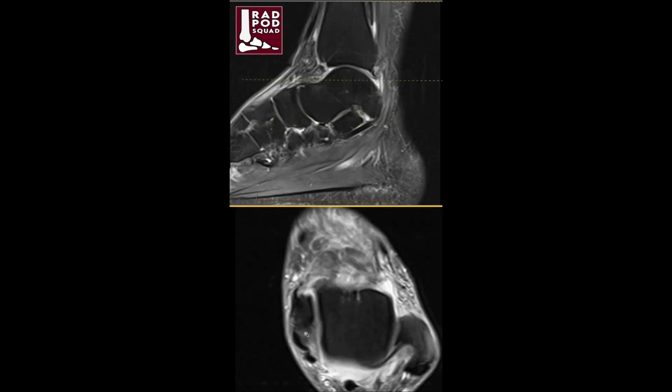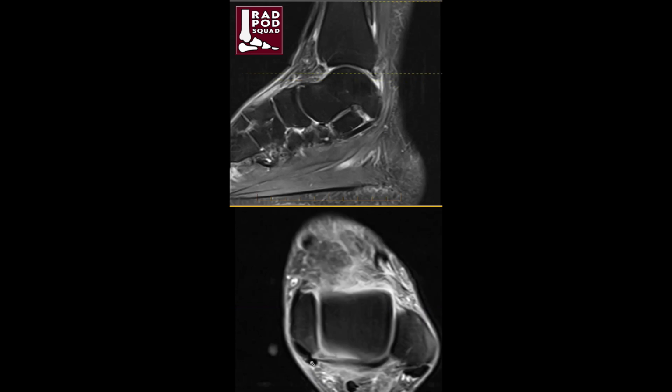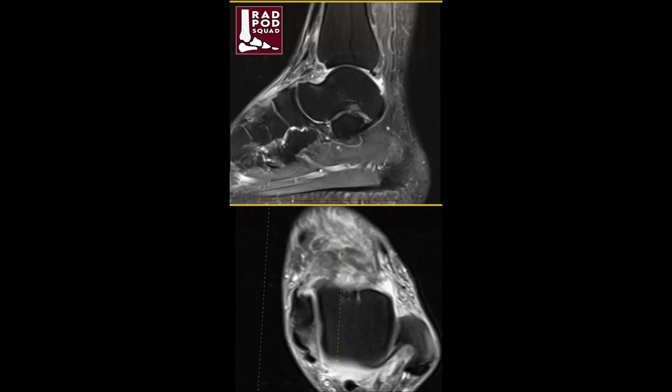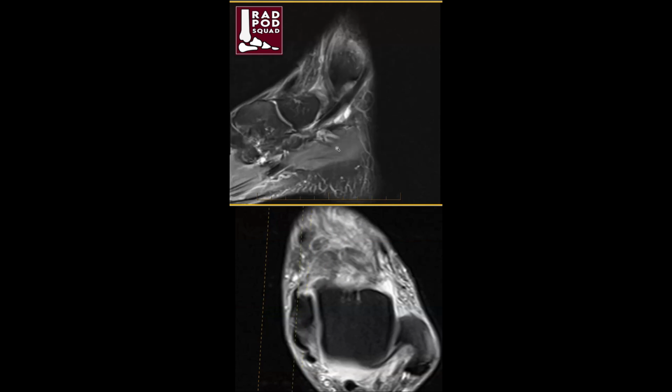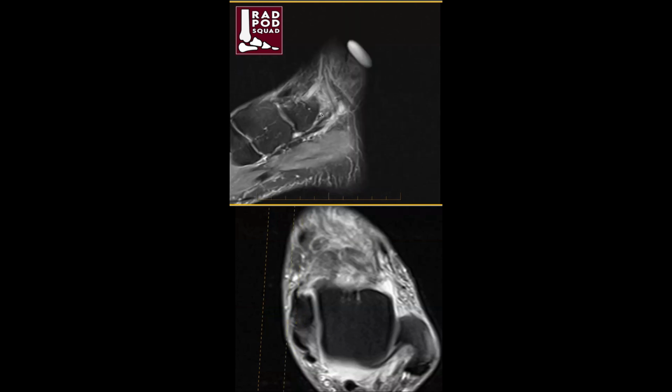So taking a look at this, you can appreciate that it's slightly blurry as we go down through a standard axial sequence. And before we go to our axial oblique imaging, I just want to show you on sagittal, we'll be taking that posterior tibial tendon down, passing the region of the deltoid ligament to move down towards where we expect 2/3 of that tendon to attach to the medial navicular.